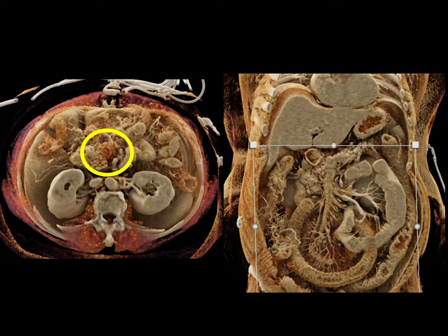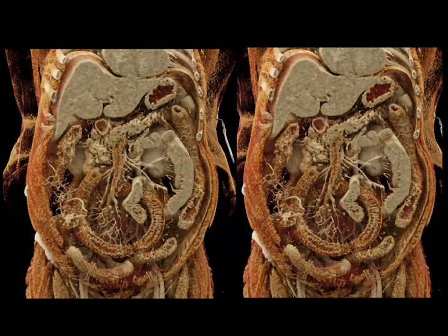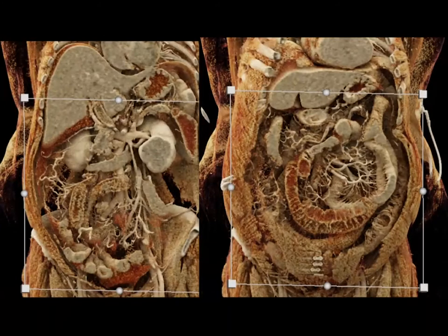Look at the vasa recta. Look at the portal vein occlusion and SMV thrombus. Look at the kind of detail we can get. And here we're creating additional views. Again, you can see the edematous changes in the small bowel, the abnormal compared to the normal bowel, the wet fold pattern, the prominent vessels, and you can see a range of images which show this, as well as showing the occluded portal vein and SMV.